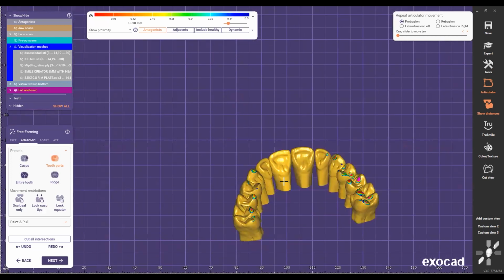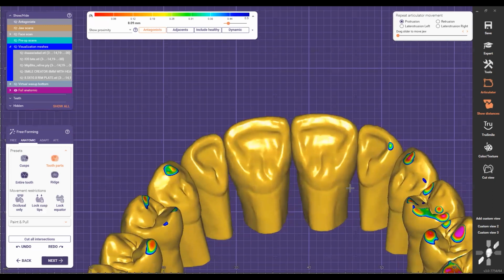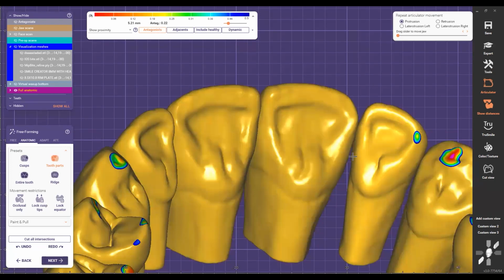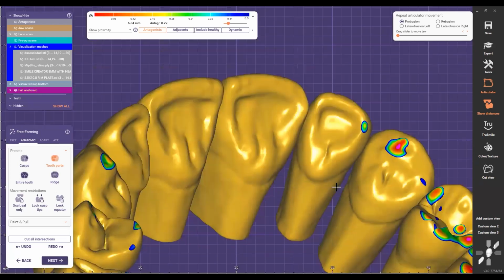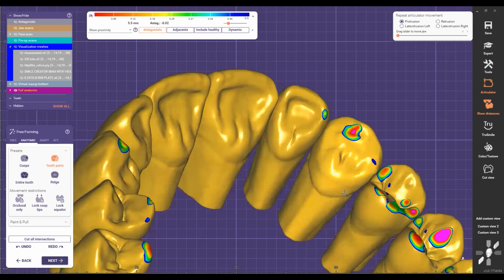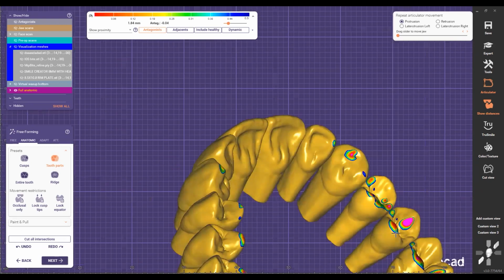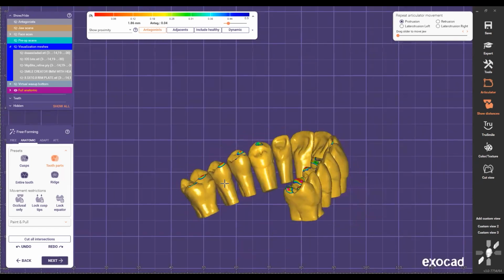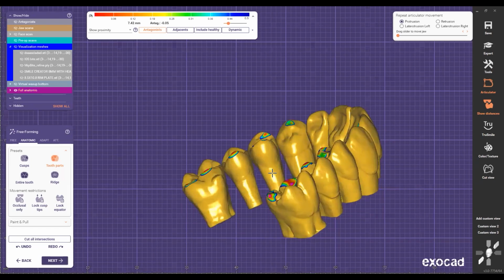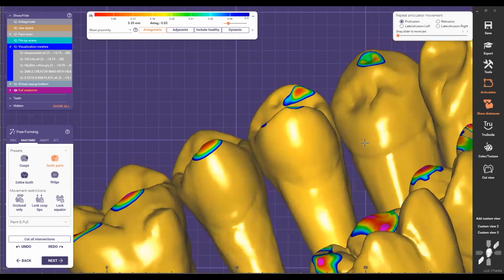So here I'm going from the back, so I can close these areas and not compromise the anatomy in the front too much. Plus I'm reinforcing everything from here too. So just try to pull it from an area where the software allows you to do it. And then I go from here, from here, from here, and close here, there.